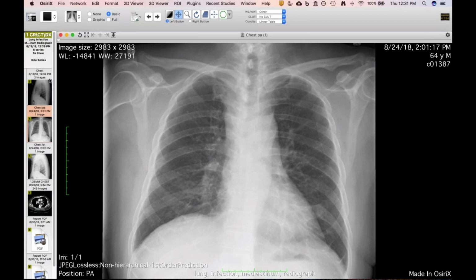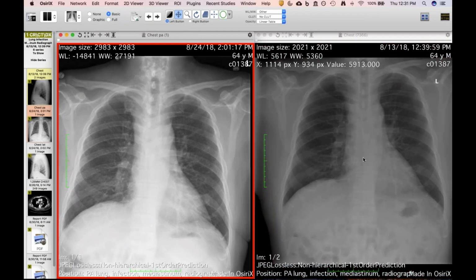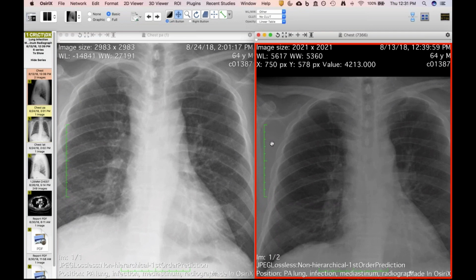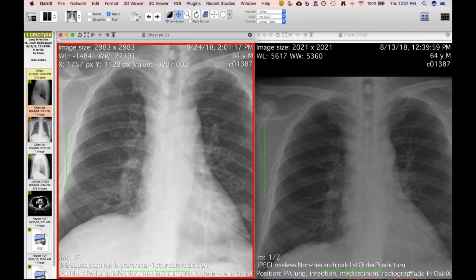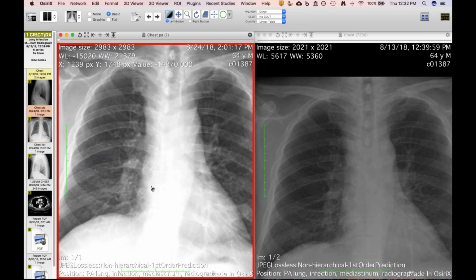Yeah, exactly. So this was on the 24th. There was a radiograph from a week before, and you know, still plump right paratracheal region. It's an upright two view, and sometimes we get the large patient that has increased fat there. But yeah, that's a little too much. And Howard, maybe you could argue there's a little bit of mass effect on the trachea as well. I don't know. Maybe they're just a little rotated here, but the lungs look pretty good on this study.